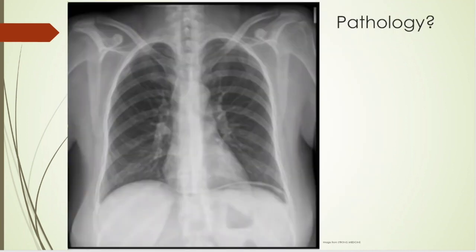So here's another interesting one. Let's start off doing A for airway. Here's your airway. You see it bifurcates. Looks like the carina is going to be right about here. B for bones. Bones all look pretty good. Clavicles look all right. I don't see much in the shoulders. Vertebrae you can see, and they are looking okay, or the ones you can see anyway.